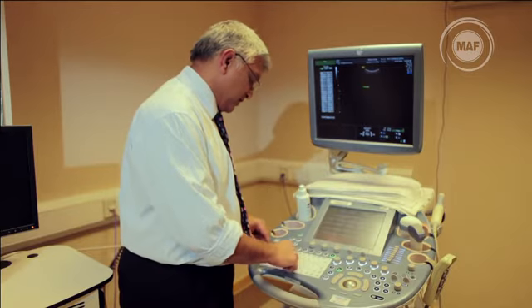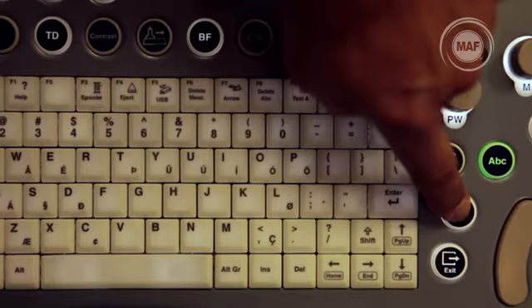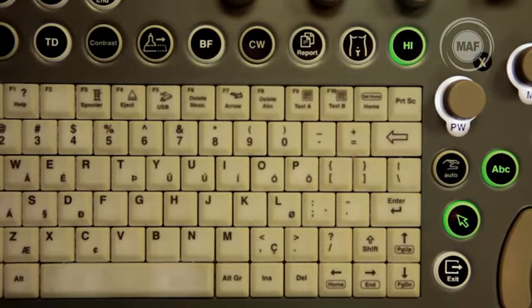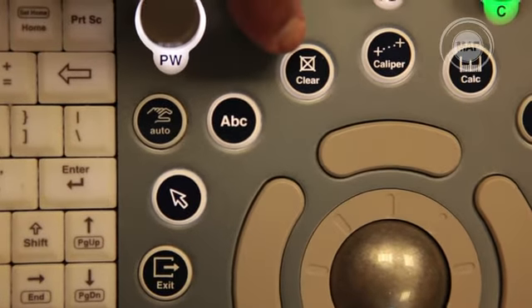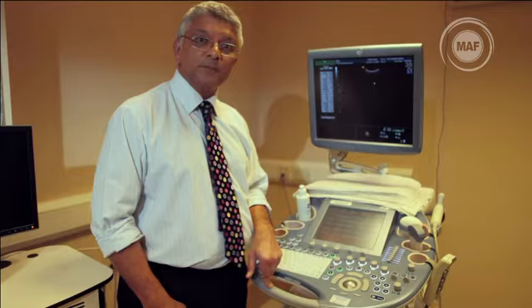single umbilical artery. And there might be a pointer. You might want to point something. And usually they'll have a delete or a clear key labeled, and you press that and it will delete and clear all your alphanumeric key.